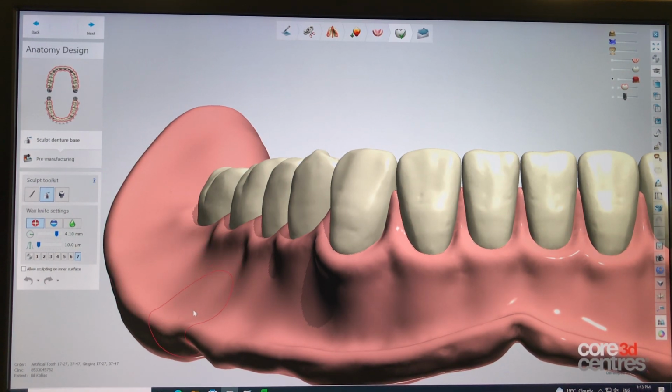So you can see material is building up quite nicely. I think the trick here is to find the right intensity of the buildup by having the proper settings here that you see fit, and also keeping your mouse moving all the time. Don't stay still. Keep it moving.